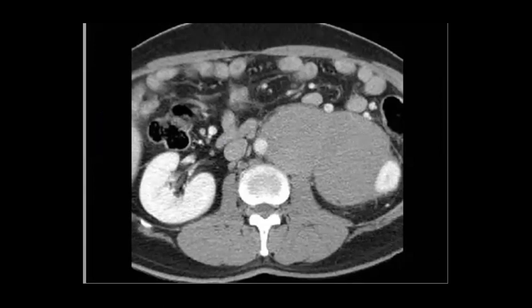Nice. So when you find this appearance, especially in a young patient, you will go to check the testes. Which one, like the major one, which testicular tumors send this retroperitoneal spread? Seminoma. Yes. So you are going to check for seminoma.